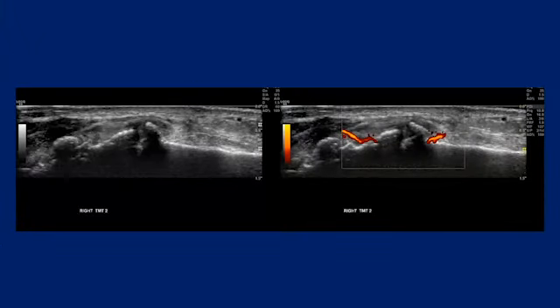So these are longitudinal images of an arthritic second TMT joint. I'm not sure everyone's used to looking at ultrasound, but we can see that there is deformity at the dorsal aspect of the joint with osteophytes, in contrast to the more normal longitudinal bright cortex of the metatarsal shaft to the right of each image. There is hypoechoic inflammatory debris distending the dorsal joint recess, and we can see on the image on the right, when we put on power Doppler, that there is increased blood flow indicating the presence of inflammation. Next.